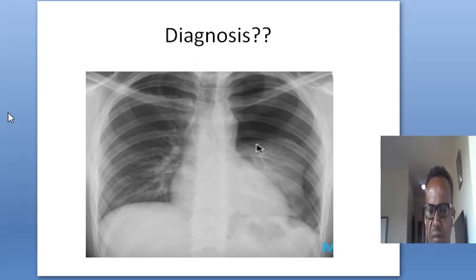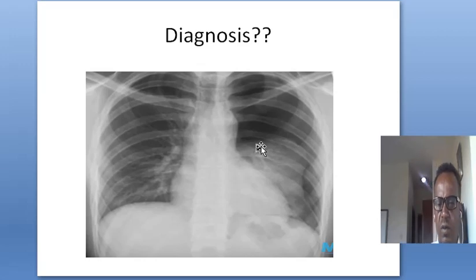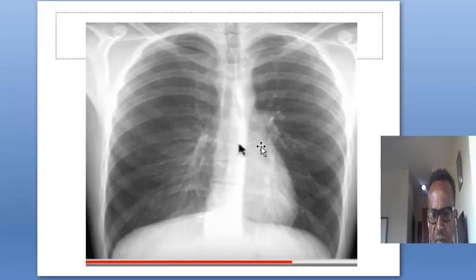So this is simply a significantly collapsed lung. This is a lung border with no air bronchovascular markings. You can see them to the end here, but here you don't see them above these lines. So this is a massive pleural collection on the left side with the lung collapsed toward the hilum.